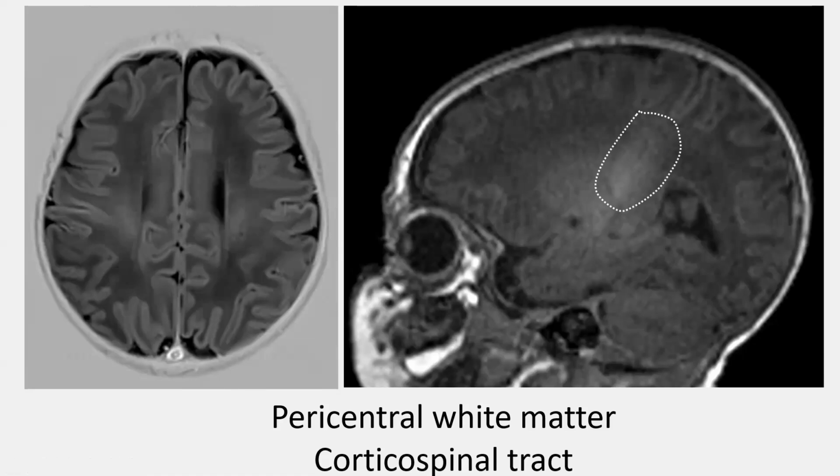It is not abnormal, it is normal to see some myelination here because newborn children, despite the fact that their motoric abilities are not the same as those of full-grown adults, self-evidently, are able to move a bit. And as myelination continues and the brain further develops and matures, their motoric skills will also develop further.